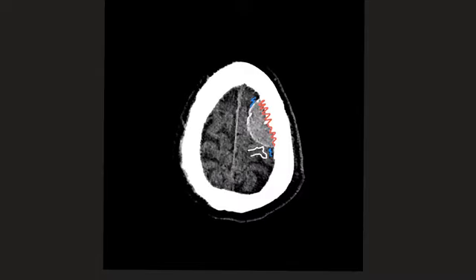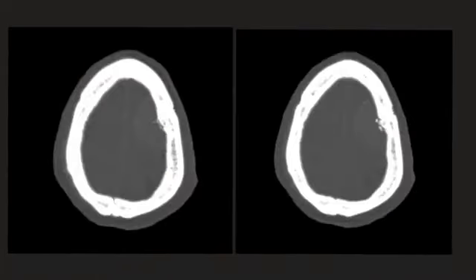Let's take a look at the bony windows. You can also see that the adjacent bone is hypertrophied and expanded, in keeping with bone hyperostosis. So overall, this lesion, which is partially calcified, has a broad dural base, has a CSF cleft, and has bony hyperostosis. This is in keeping with a large meningioma. It's probably been there for a while, but as we saw on the brain images, there is some brain edema, and this will require a referral to the neurosurgical team.